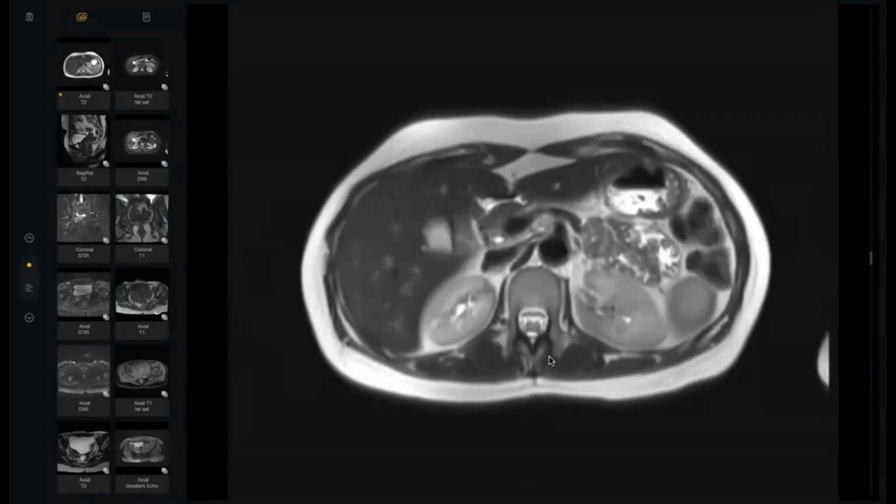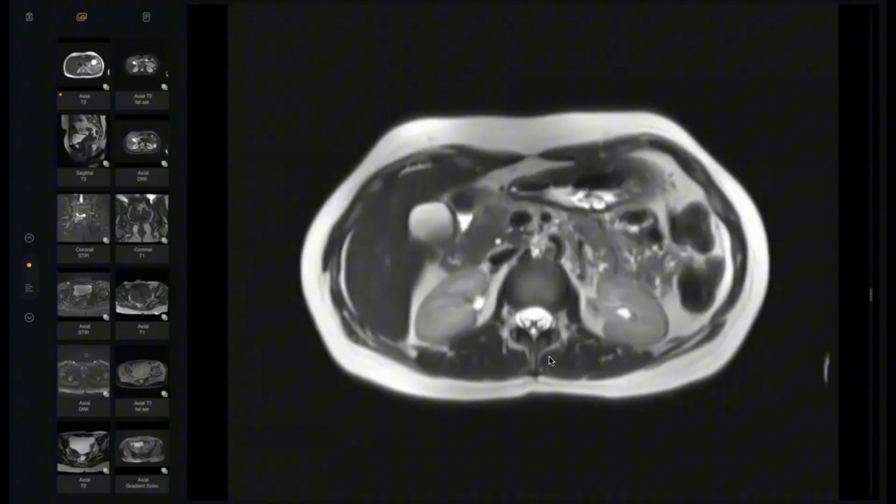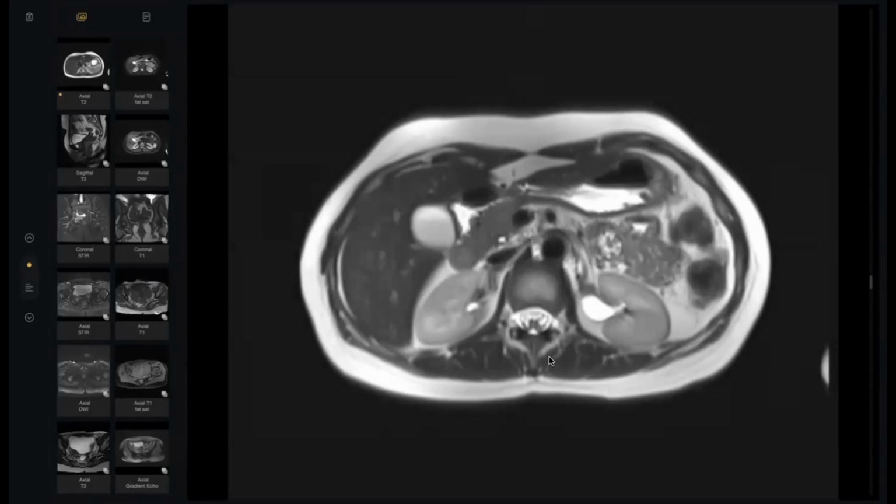Look at the pancreas, please, doctor. Pancreas. What happened? Sir, I can appreciate the head and body, head and neck region, but the tail is atrophied and somewhat replaced by fatty tissue. No tail at all. Yes, there is only head and uncinate process and neck region seen in this current slice.